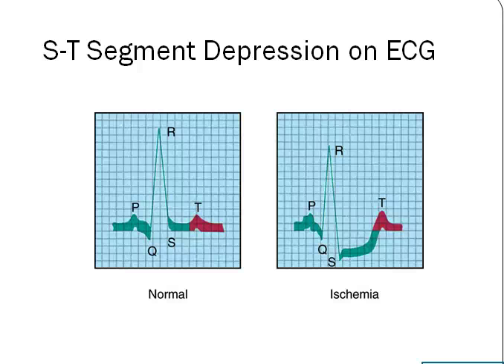So here you can see the ST segment depression. As I mentioned on the left, if you know what your normal PQRST is supposed to look like, then if you see something abnormal, it could mean that the person has some underlying heart disease. So you can see that the ST segment is what's called depressed. It's sort of lower, and it's also on a slope. And so that is something the cardiologist will look at.